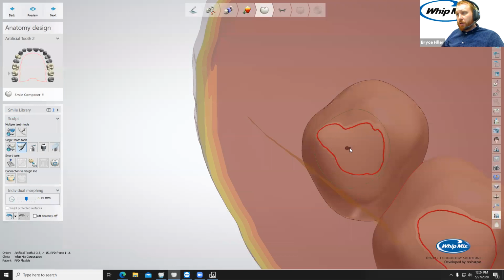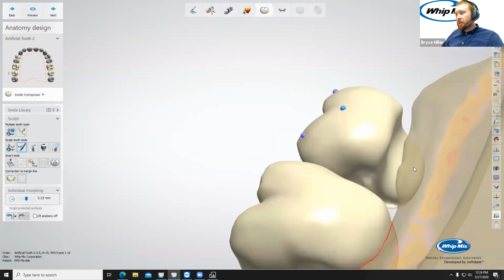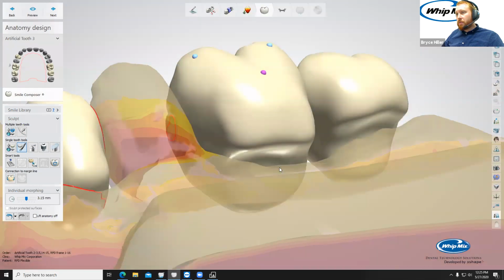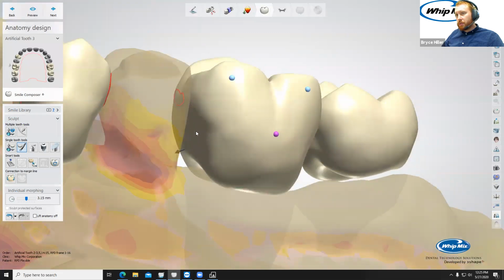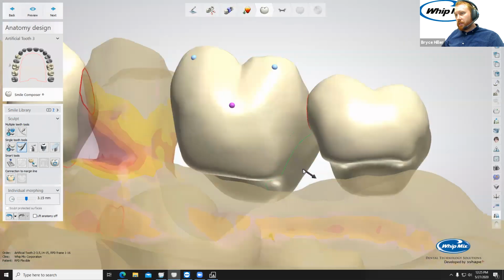If I hold the control key, I've got that black arrow that allows me to morph unidirectionally. Then I'm just going to come underneath and start morphing these. There's no set distance that you need. You just want to make sure you have enough room for a good tooth pocket. So when I say there's a little bit more of a learning curve, this is really what I was referring to. Let's fill that in just a little, just because I'm OCD, I can't have it.